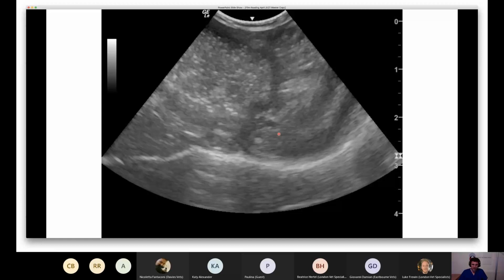So this is really the area that I was most interested in evaluating in this patient. We've got a dog that has a huge stomach, and in the lateral abdominal radiograph, we've got an accumulation of gritty, gravelly looking material in the cranioventral abdomen that might correspond to material within the pylorus. And if you have a patient that has a huge stomach and there's really any suggestion that there's anything going on in the pylorus, then you need to be concerned about a gastric outflow obstruction.